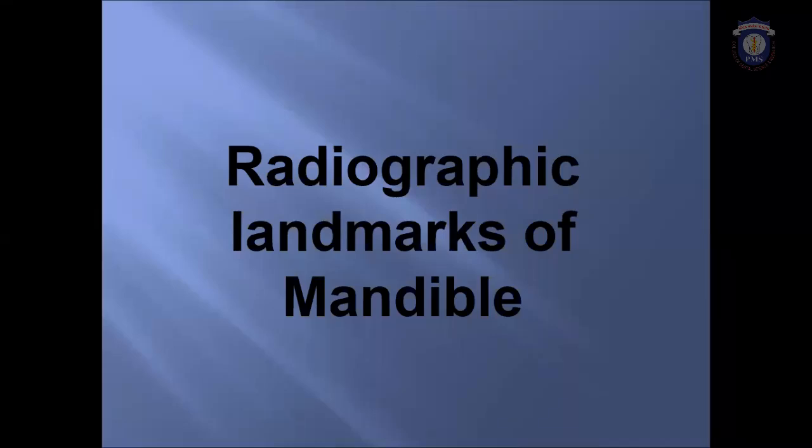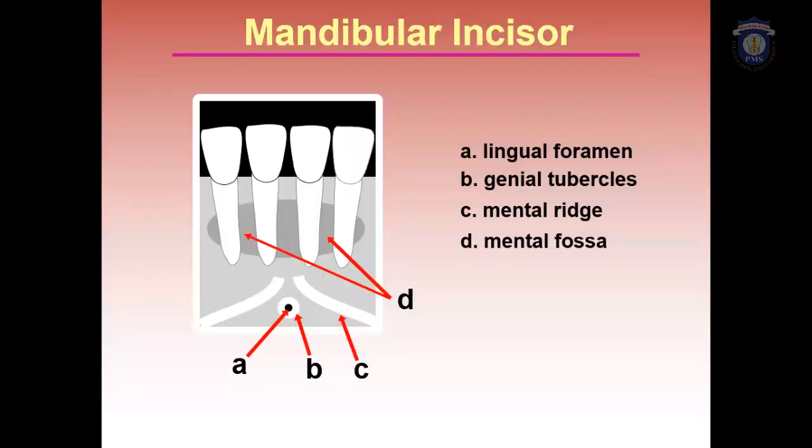Good morning, class. Today's topic for discussion is radiographic landmarks of the mandible. We shall discuss the radiographic landmarks of the mandible so as to help us to interpret an IOPA, or an intraoral periapical radiograph. So we shall start taking the mandible part by part.